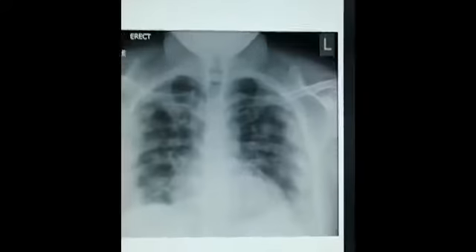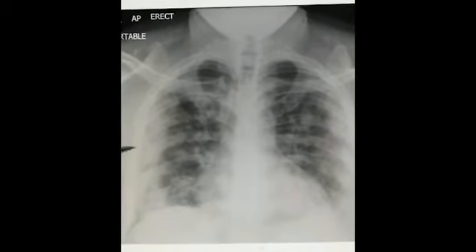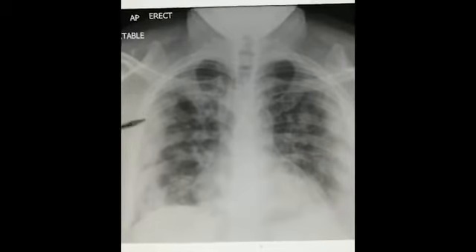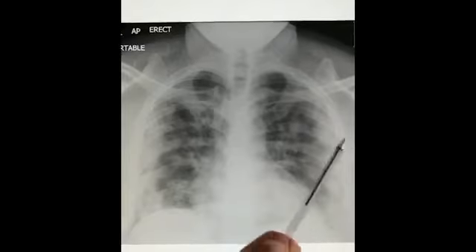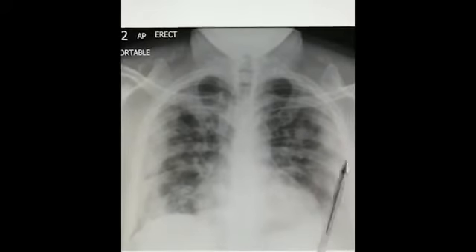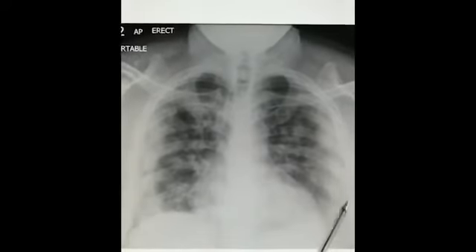Okay, so moving on now to a classical coronavirus case that we've had. This is a 68-year-old man. And what you can see here is the peripheral patchy consolidation in the mid and lower zones, obscuring those nice rib markings that we saw on the previous x-ray. Now, this is normally always bilateral, so as you can see on the other side, very much the same thing. It's patchy, and it's peripheral.